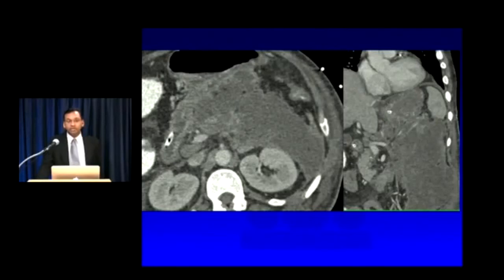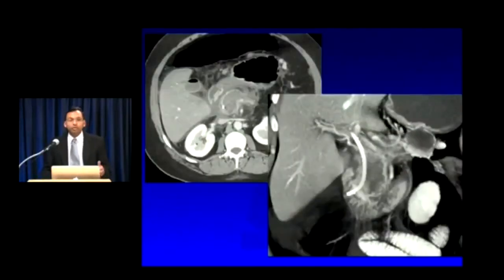Here's an example. This patient had necrotizing pancreatitis about a week ago. Big fluid collection replacing much of the pancreas. Because of the time course, notice that, and because of the lack of loculation, you're going to use the term post-necrotic fluid collection. Here's another post-necrotic collection that's actually intraparenchymal within the pancreatic head. Notice that it's inhomogeneous, has some internal hemorrhage. This is a post-necrotic fluid collection.